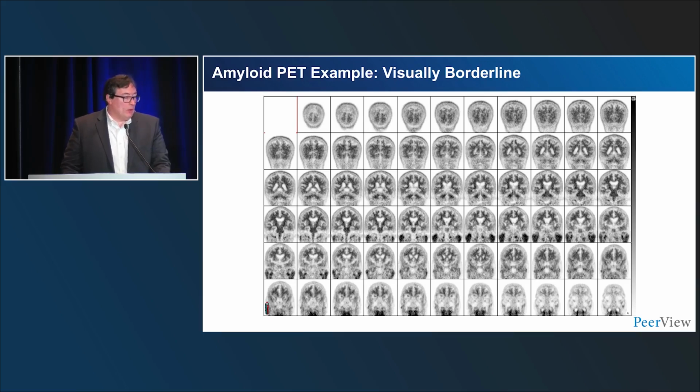You also want to review these individually. And you also want to be looking for relatively large regions, meaning we're not trying to find small areas. We want to see slice after slice, in a brain region, that they're abnormal. And I would argue here in the temporal lobe, particularly on the right, but also on the left, there's decreased gray-white contrast. And in general, if you compare to the cerebellum, it's slightly reduced.